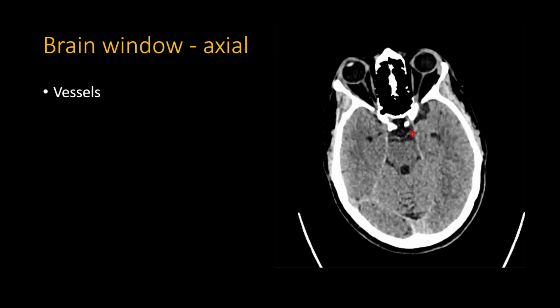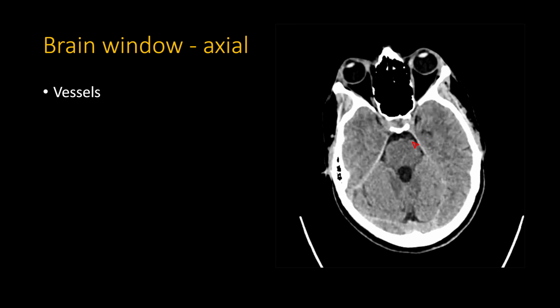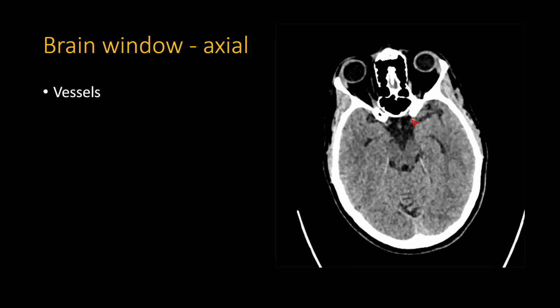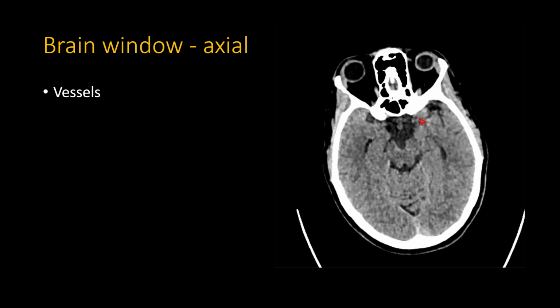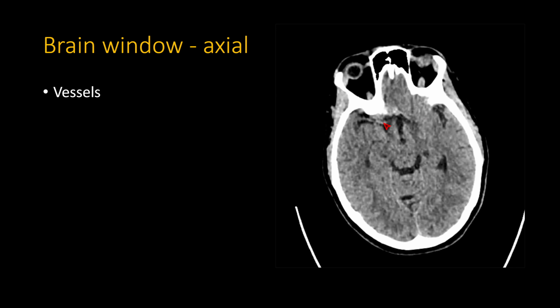So you follow out your basilar artery. Now it's splitting up, as you can see, into both posterior cerebral arteries, right there and right there. Same thing with the ICAs. Now the ICA, the cavernous portion, would be impossible to tell on non-con from the adjacent cavernous sinus. They're both filled with blood and will look the same on non-con. But here there is the left carotid terminus splitting up into the MCA. And then the ACA, it's a little bit better seen here on this other side here.